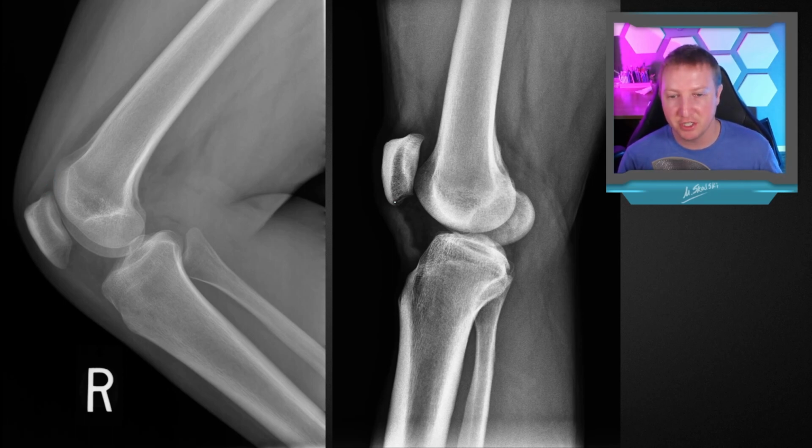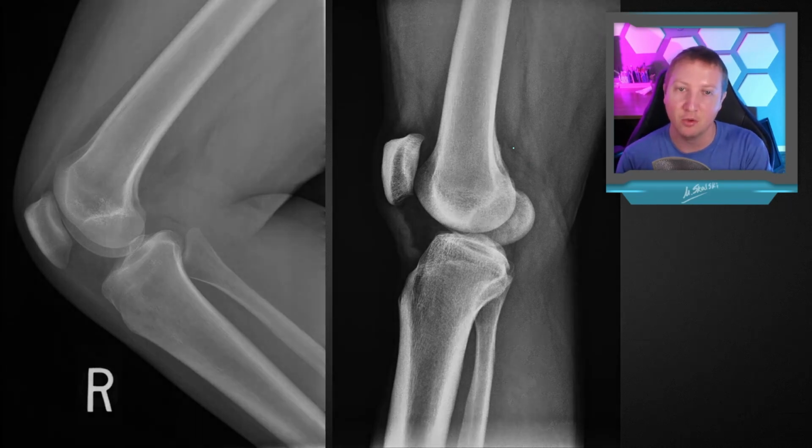And similarly here in extension, now we get this kind of folding and redundancy of our lax patellar ligament. And it makes it hard to see, is there a joint effusion here? Is there not? Maybe I can see a little bit of physiologic amount of fluid here, but our confidence is going to go down in those scenarios. And this is also somewhat oblique lateral, so a number of different issues with that one.